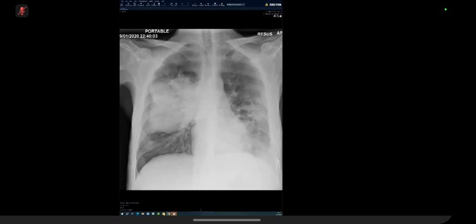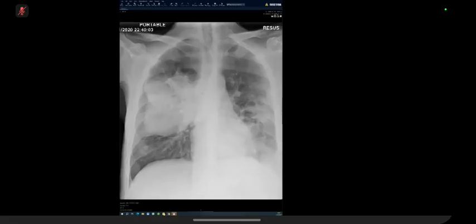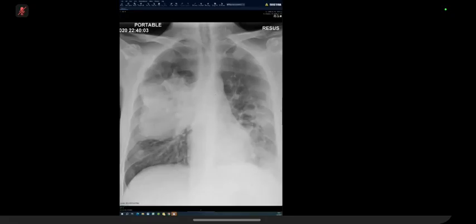So you mentioned bilateral lesions, and you meant this one, and this one? I don't know if you can see my pointer, but there is a large one on the right, yes, and another one in the left hemithorax in a more peripheral distribution and more in the lower zone. Okay. I want you to describe these abnormalities a bit more, if that narrows down your differential.